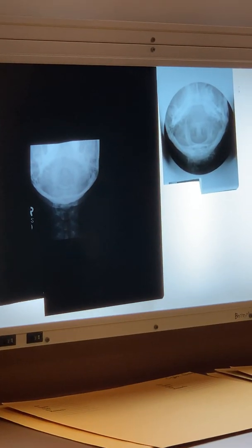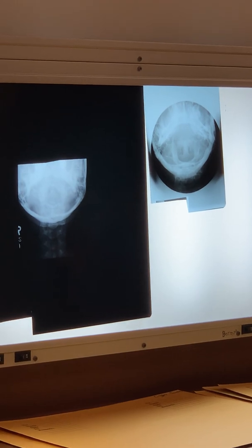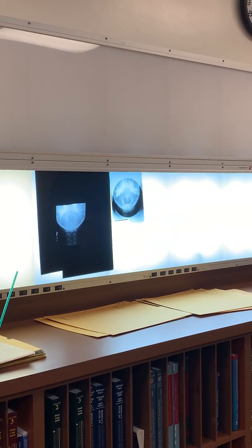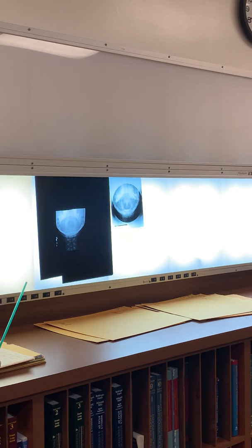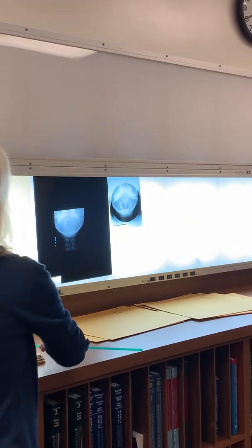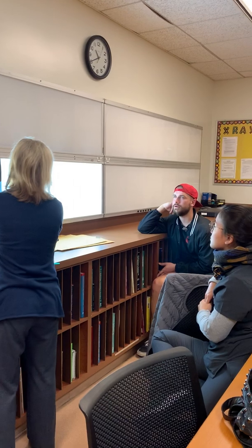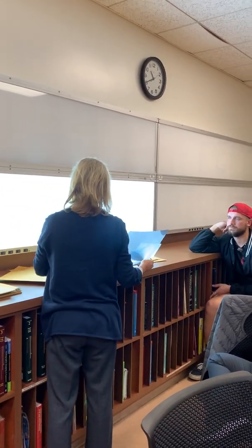But if your teeth are in the way, just bring it up, right? Correct. So he could have repeated it, but he just went directly to Fuchs. Maybe the occipital bone and the teeth were so close that he didn't think it would work. Sometimes there's nothing you can do but just do a Fuchs. So that's an AP, you go up. There is the Judd. No one ever does it, but that's a PA.